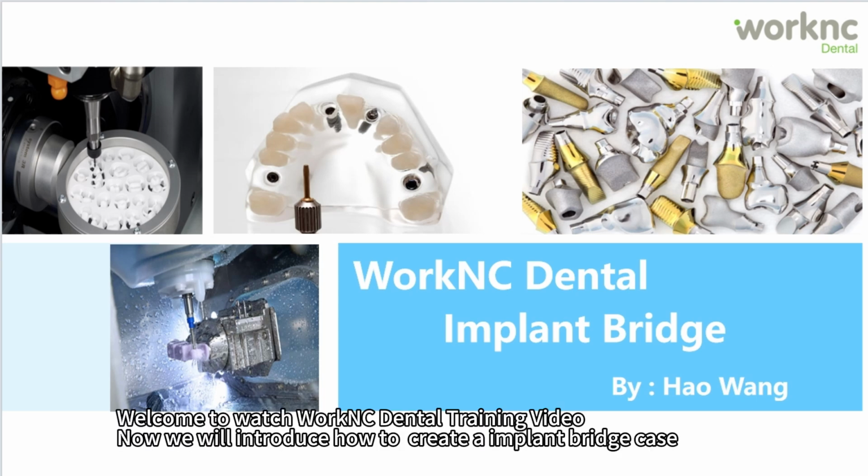Welcome to the WorkNC Dental training video. Now we will introduce how to create an implant bridge case.